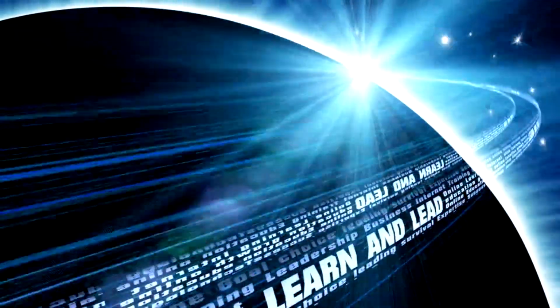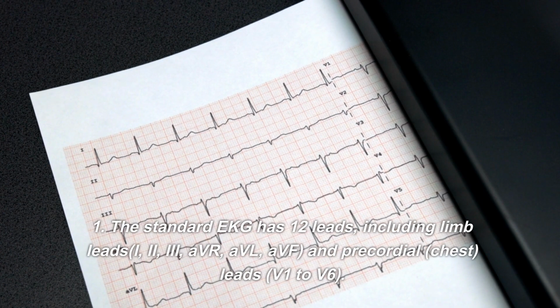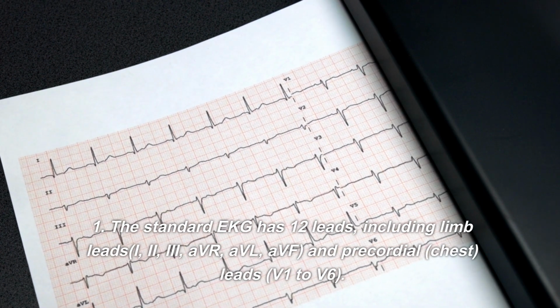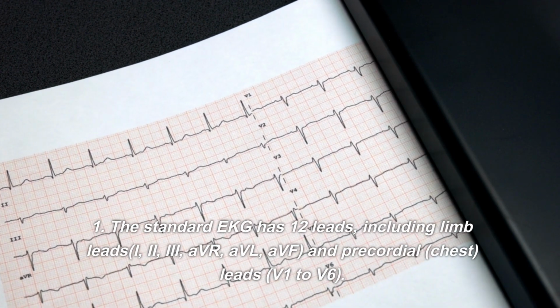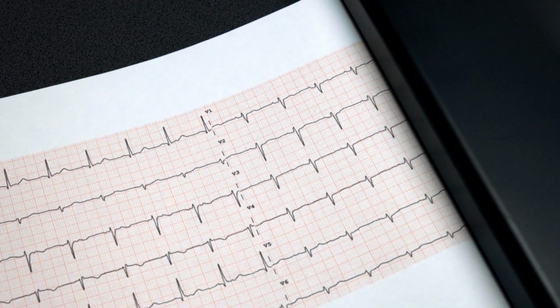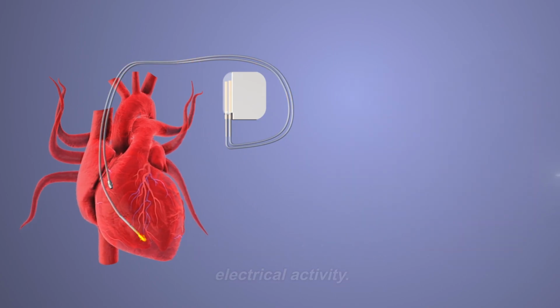Placement of leads. 1. The standard EKG has 12 leads, including limb leads I, II, III, aVR, aVL, aVF, and precordial, chest, leads V1 to V6. 2. Leads provide different views of the heart's electrical activity.